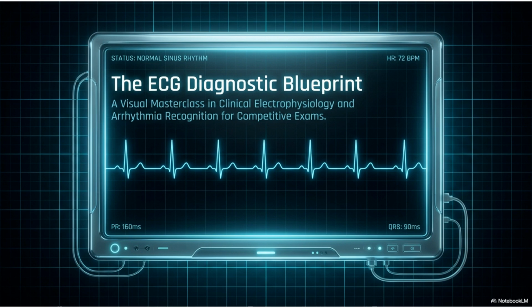On this title screen, we see a normal sinus rhythm with a heart rate of 72 BPM, a PR interval of 160 milliseconds, and a QRS of 90 milliseconds, all of which fall perfectly within normal clinical limits.